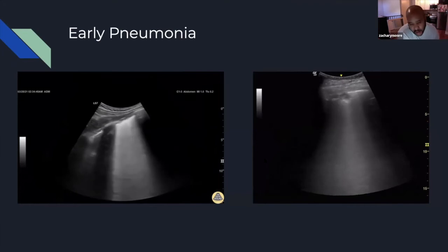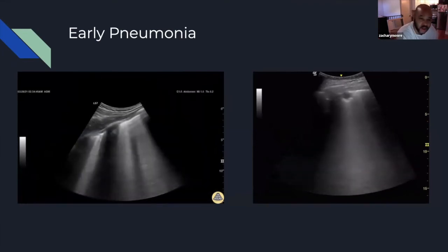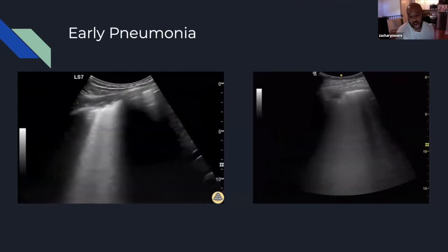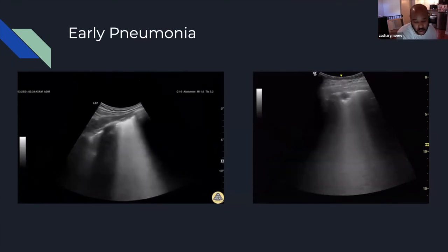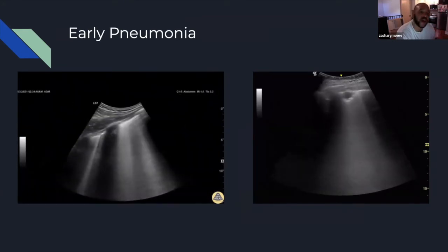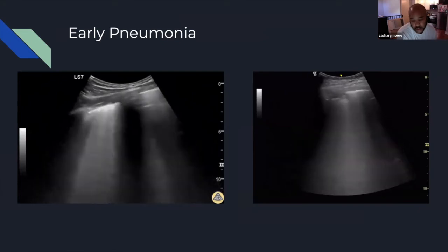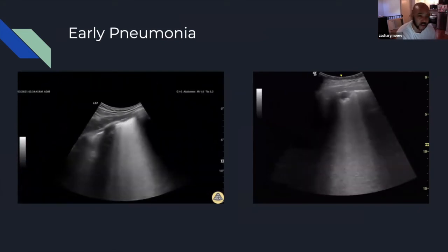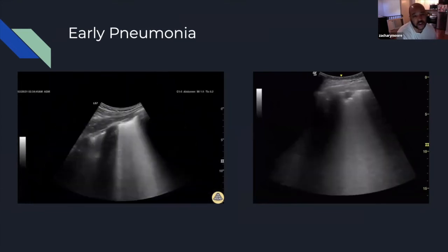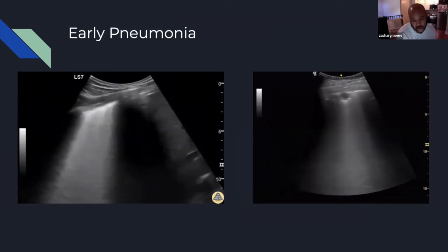And I know nowadays with all this COVID time, we're quick to put the ultrasound on to evaluate for APE and so forth, but also to evaluate COVID. You might have similar signs as well. You might see the scattered B-lines with subpleural consolidations, but if you do an echo, you evaluate the EF, and you look for a non-plethoric IVC, you can prove that these B-lines are not really pulmonary edema. There are other signs to go with COVID, but I'm not really going to discuss them. Just take into consideration when you're scanning someone that it could be a COVID pneumonia and so forth.